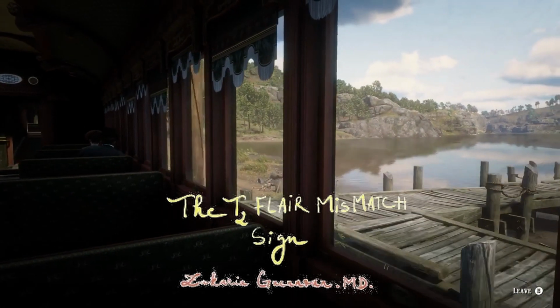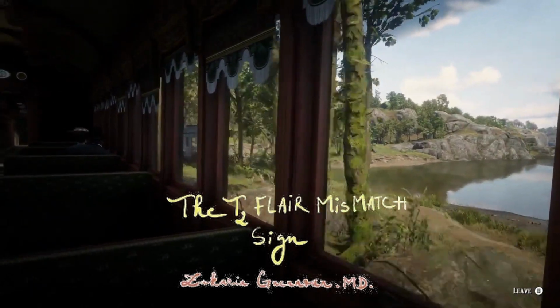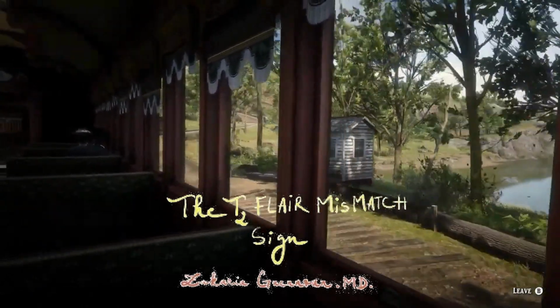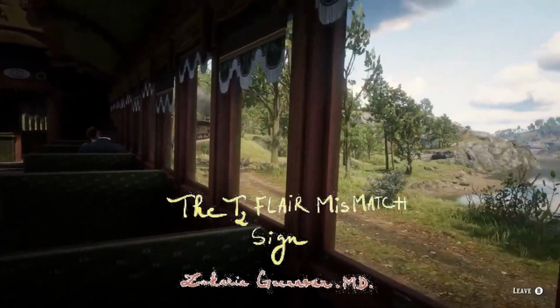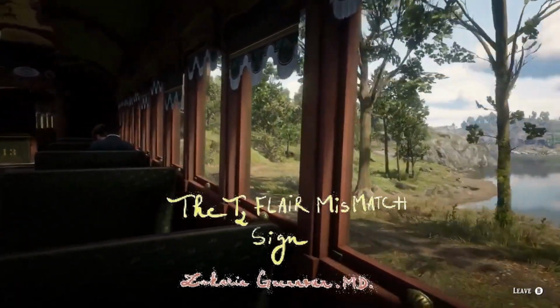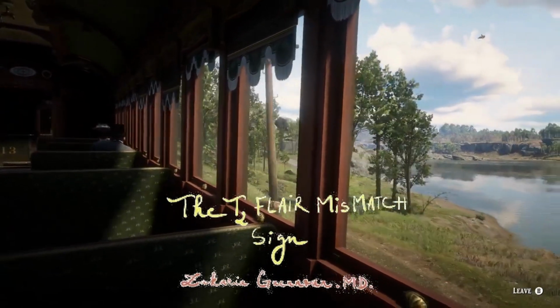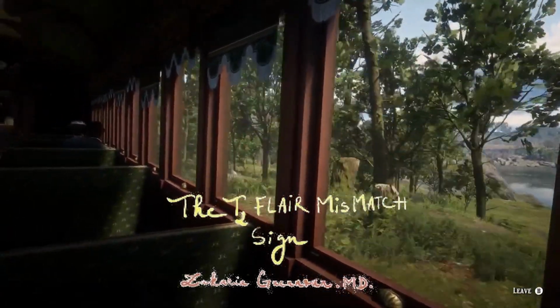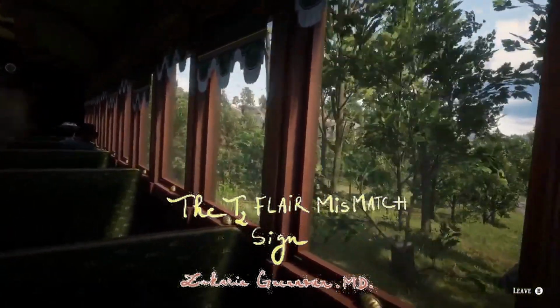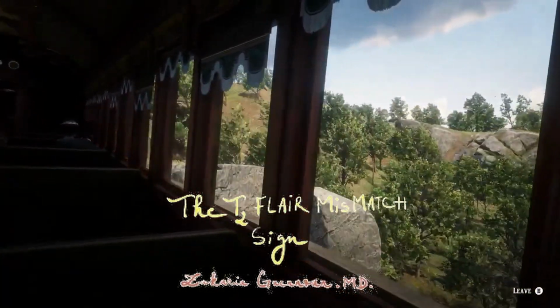Okay, now that we have put some context and learned about the relationship between genomics and CNS tumors, what does MRI have to do with any of this? Well, there is this typical appearance of a tumor on T2 and T2 FLAIR, which is highly specific for astrocytoma IDH mutant 1p19q non-codeleted, exhibiting a focal T2 hyperintensity appearing as slightly hypointense on T2 FLAIR with hyperintense peripheral rim on T2 FLAIR. These genomic features are nearly exclusively found in astrocytomas.